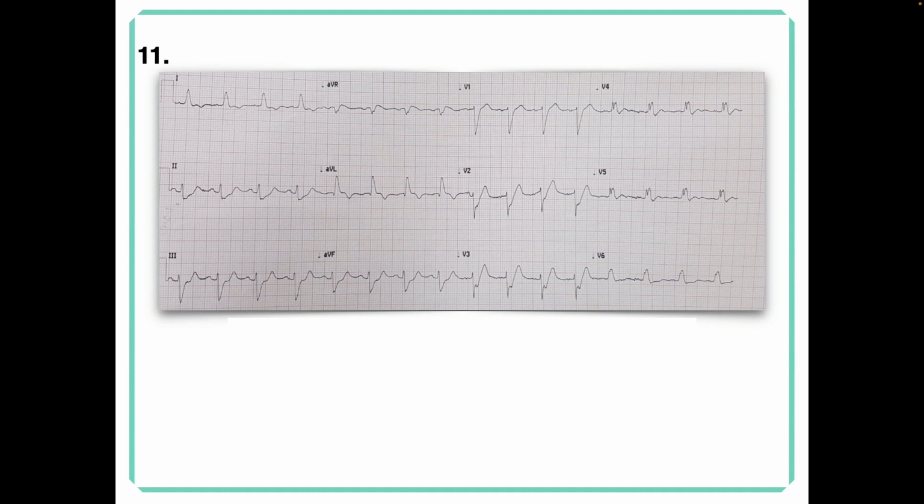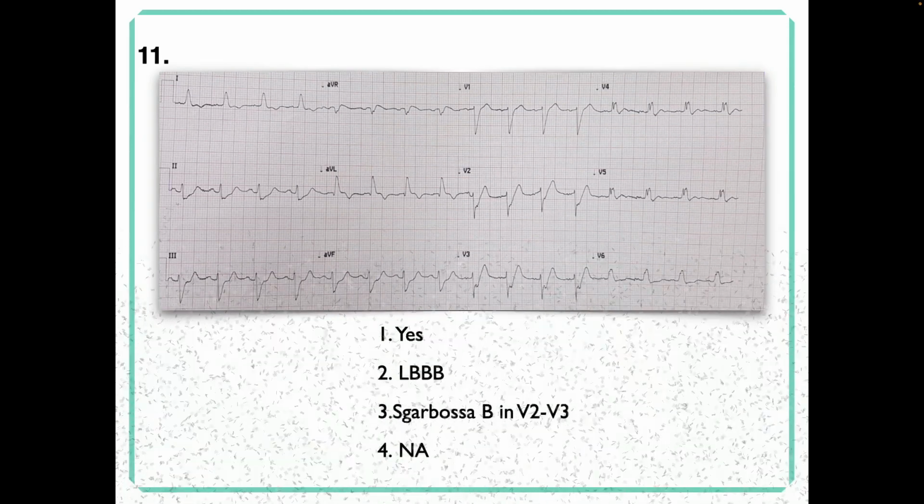And then for ST elevation in aVL, V4, V5, and V6, and I don't see. Okay? Yeah, good. Okay.